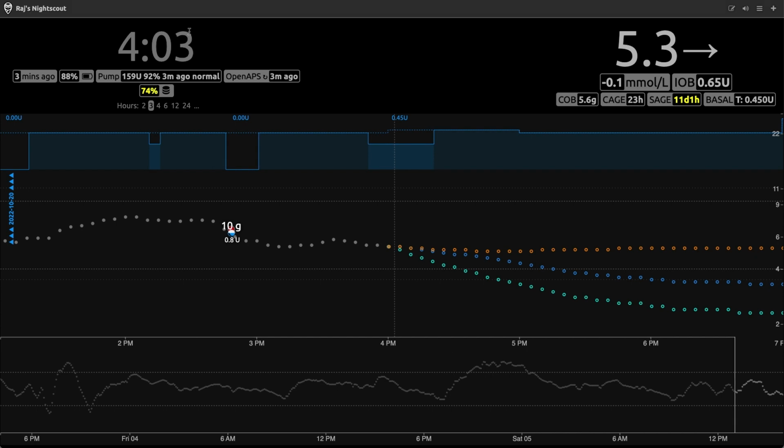To clean things up, I don't think many people are going to want to put an IP address in to access the Nightscout site moving forward. And there's a few ways that you can get around that. There's dynamic DNS services out there, and I'll put a link to a couple of those in the wiki for this repo. So you can clean it up and put in a customized address similar to what you had with Heroku if you were using that previously.